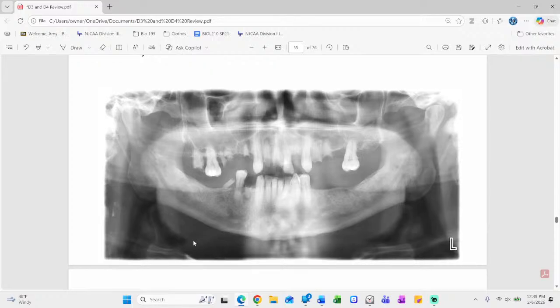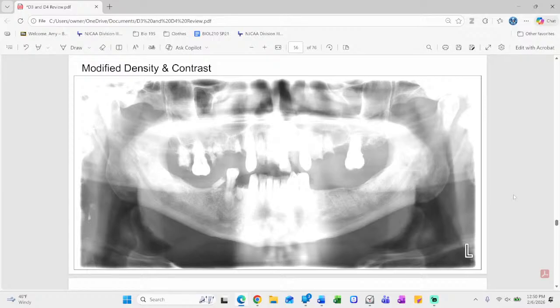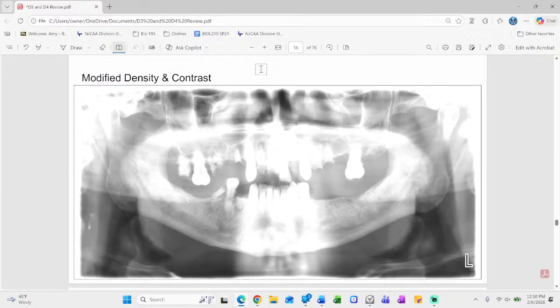Initial look at a panoramic, and again, we're going to come down to this corner. I'm going to lighten it a little bit for you. Way at the bottom, this is thyroid cartilage again. This is probably carotid plaque up here. There's my hyoid, and here's my epiglottis. So we've got all four there in one little corner. On your test, I may give you just half of that panoramic. And just like the report says, carotid plaque: yes on the right, yes on the left, yes bilateral if I give you the whole thing, or no, not there. Yes?